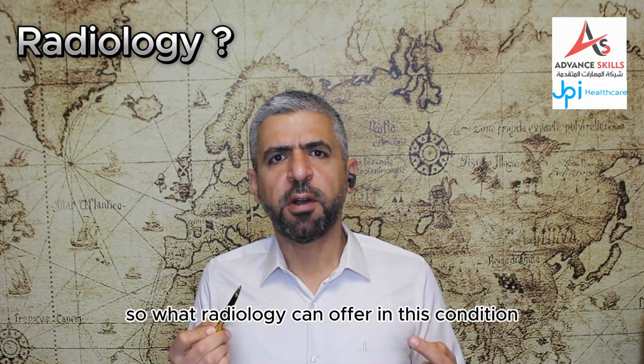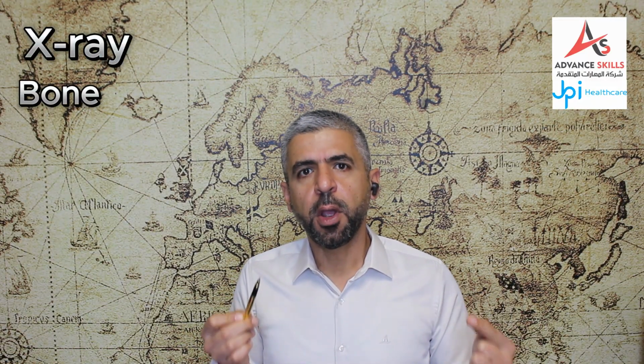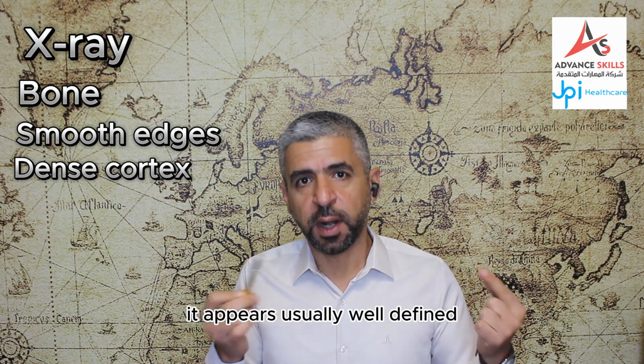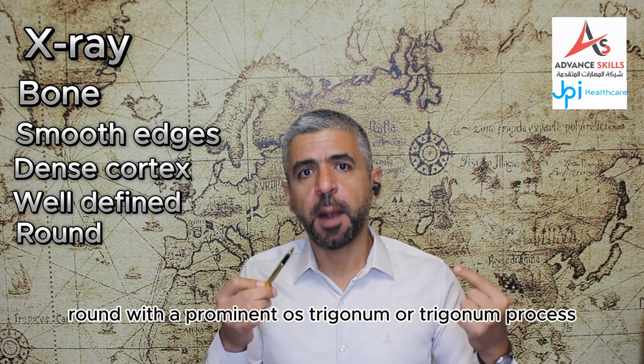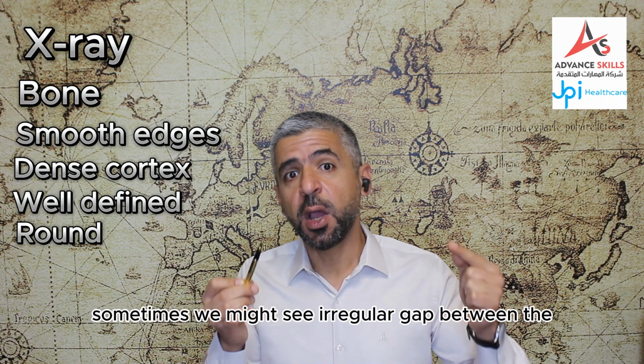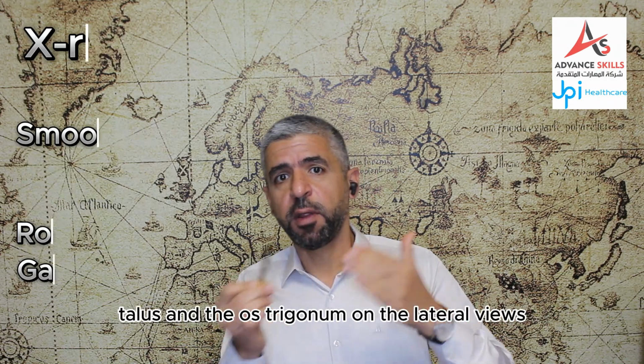So what can radiology offer in this condition? Plain radiographs will show os trigonum bone with smooth edges and dense cortical bone. It appears usually well-defined, round, with a prominent os trigonum or trigonal process. Sometimes we might see an irregular gap between the talus and the os trigonum on the lateral views.